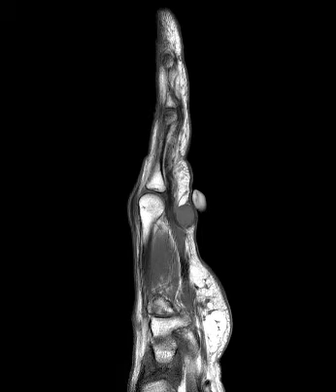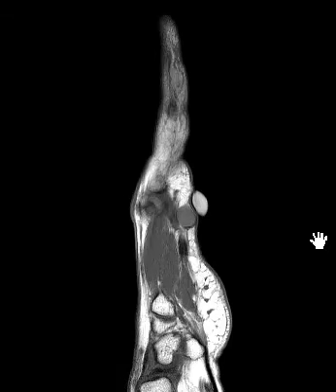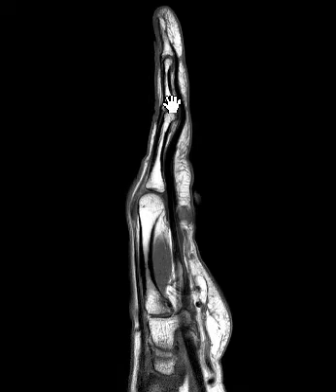Hello, this is Dr. Gay from First Look MRI, and this is a 47-year-old female with complaints of soft tissue swelling, a mass in the palm of the hand. It's in the same location she had had surgery about a year before. There was a small piece of hair supposedly embedded in the skin, and the surgeon took it out. But now there's been a recurrence in the same spot, and this is the fourth finger.